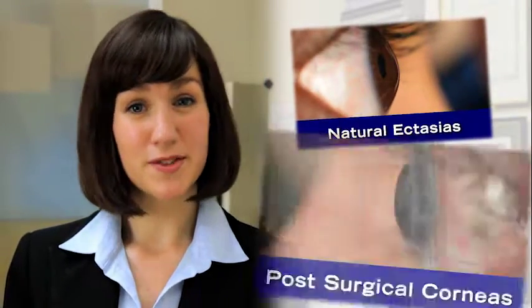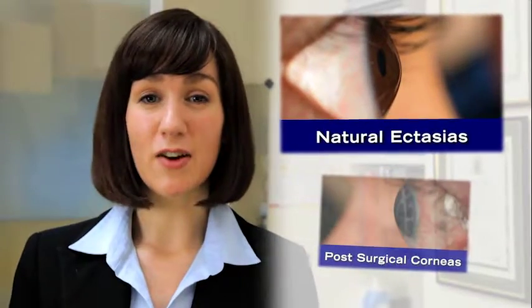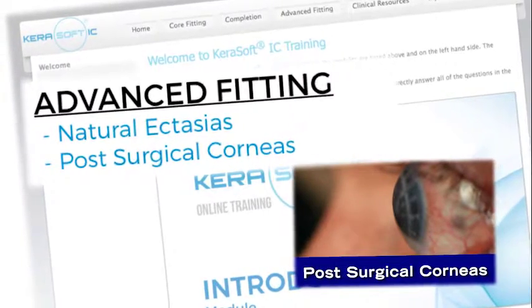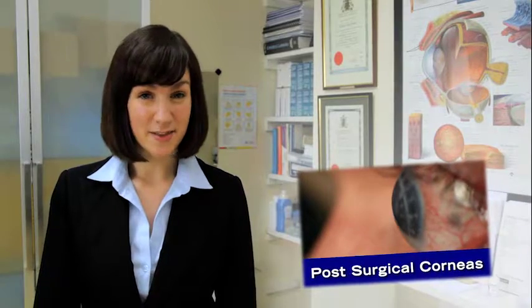Irregular cornea conditions are divided into two main groups: natural ectasias and post-surgical corneas. In this module, we will be focusing mainly on natural ectasias. Post-surgical corneas will be covered in detail in the advanced fitting section. If the practitioner has a post-surgical case, it is advised to work through the core fitting modules, which describe the fitting process of the KeraSoft IC lens in detail.